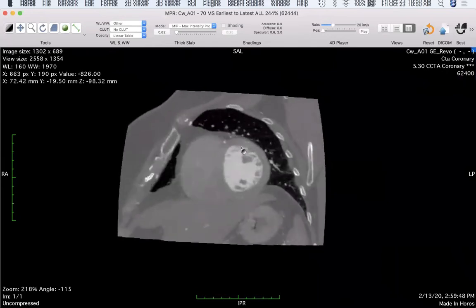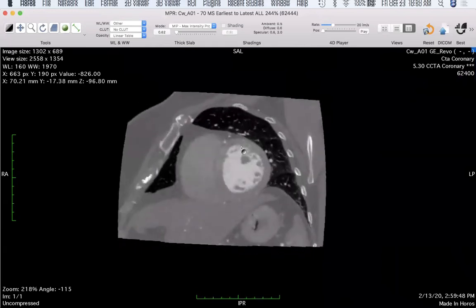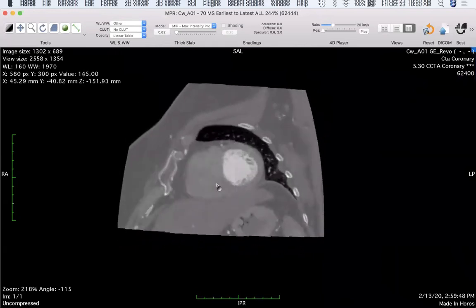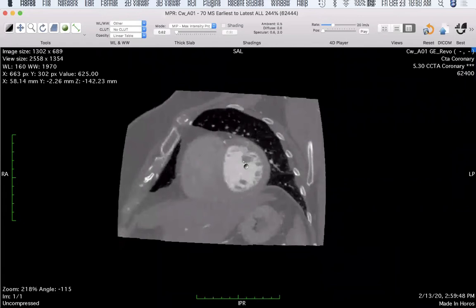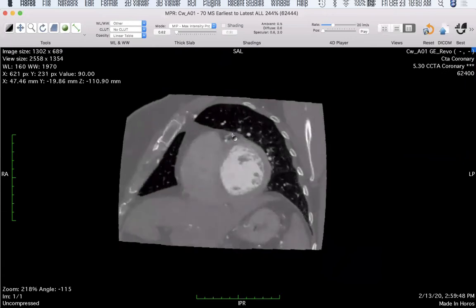And I can, again, with my two fingers, page up and down and look at the different short axis slices, right? So this is the left ventricular muscle. And what you guys are interested in is isolating these things, which are the coronary arteries, right? And that's running down the central groove between the RV and the LV is this coronary artery. And you can, as we play through different time frames, unfortunately in this mode, when I'm in the 3D mode, I can't use the up and down arrow. It'll just do a magnification. I have to click through time frames this way.